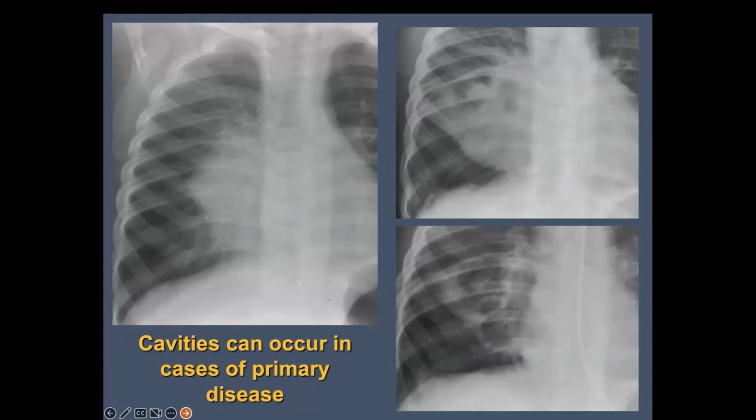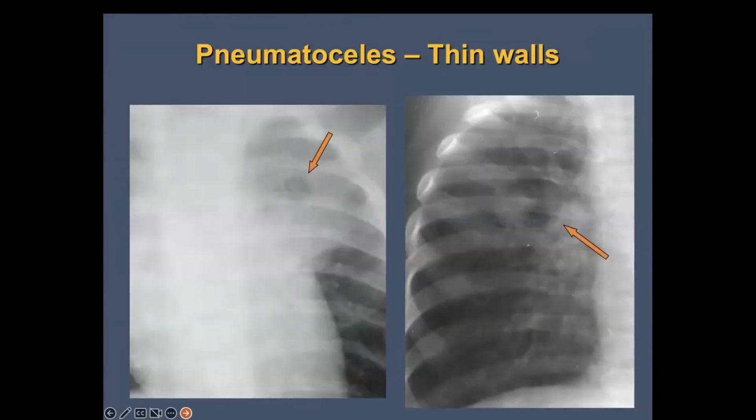And so there are really two types of cavities. There's the type of cavity that is persistent and is due to lung destruction, but also there are pneumatoceles, and pneumatoceles are really just small areas of focal air trapping within the lung due to plugging up of the small terminal bronchioles and end bronchioles. And these can be, and generally are, self-limiting. So over time, these will tend to go away. And you can distinguish these usually because they tend to not have so much surrounding airspace disease, although you certainly can see it in the acute stages like this patient.